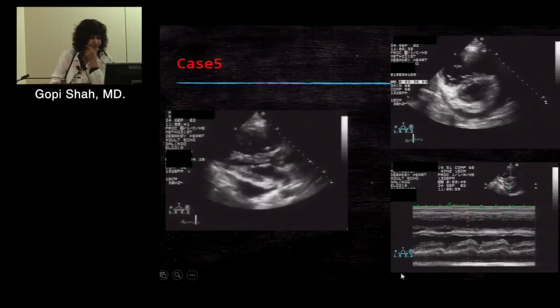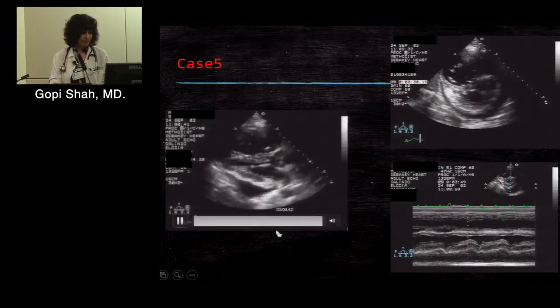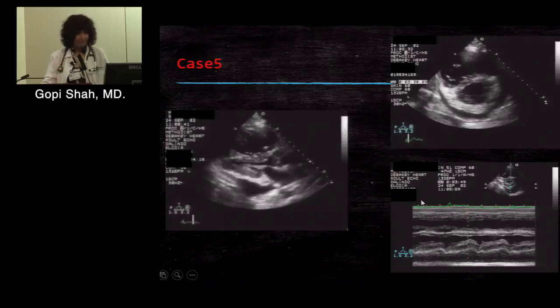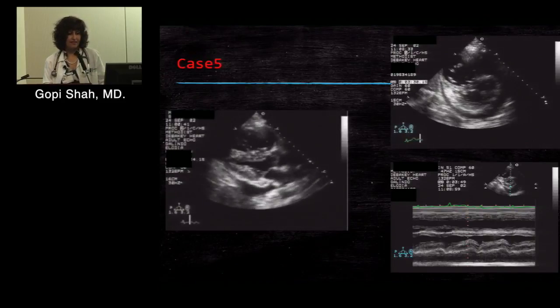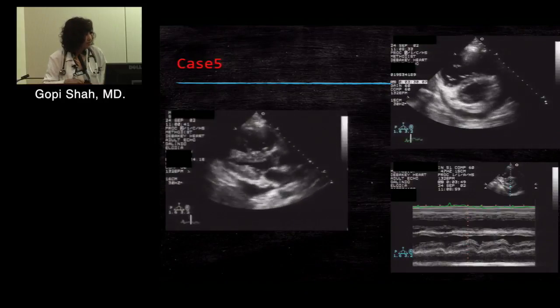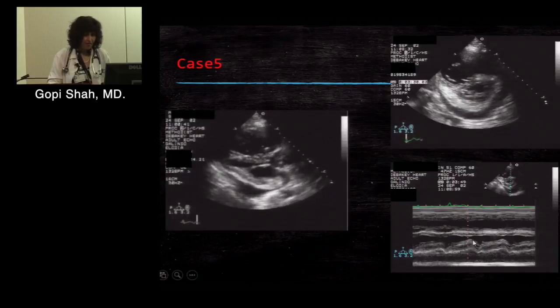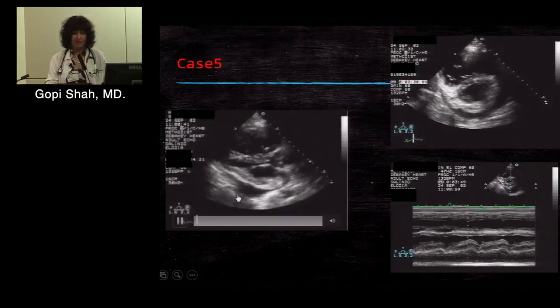There looks like predominantly posterior posterolateral pericardial effusion, which seems to be creating some diastolic LV tamponade. The LV cavity is small, the RV is massively dilated, the septum is flattened. And that's exactly what it is. So the M mode here shows beautifully the LV wall coming in during diastole, and this is an LV diastolic collapse.